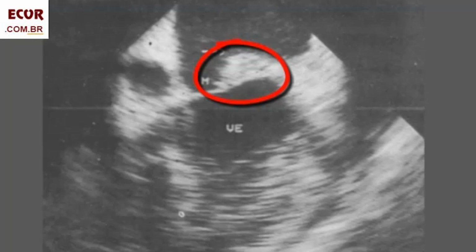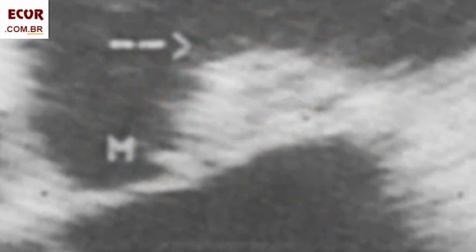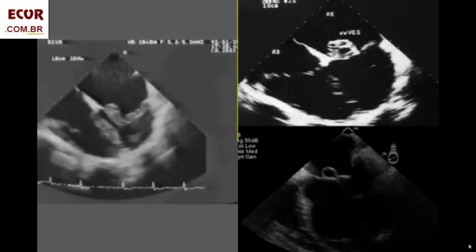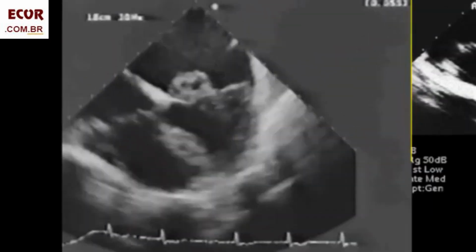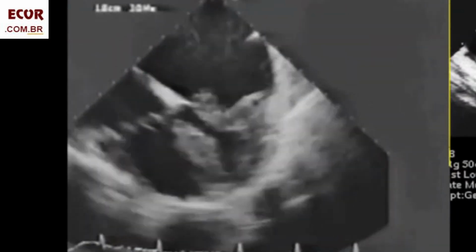Notice this enlargement of the mitral valve leaflet, seen in a two chambers TEE view. It's still mostly solid, but with some liquefied regions in its interior. This kind of abscess often leads to mitral regurgitation by forming a fistula from the left ventricle to the left atrium. Three more cases with abscess, already liquefied, forming an aneurysm of the mitral valve.